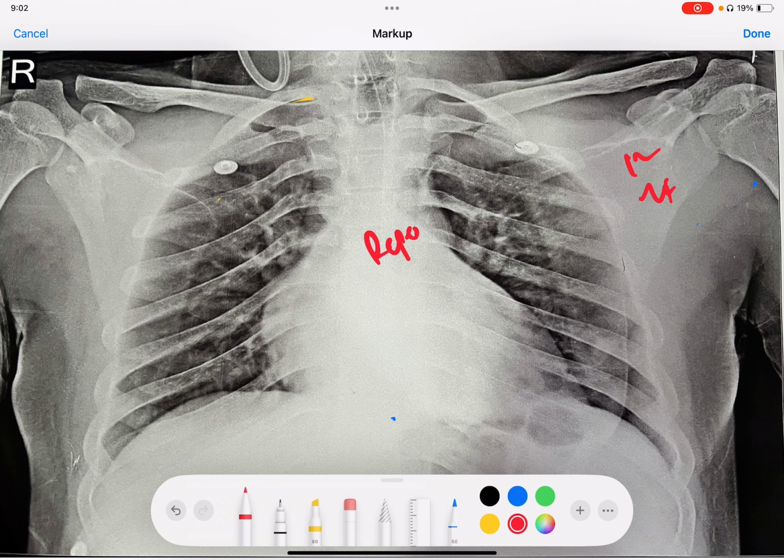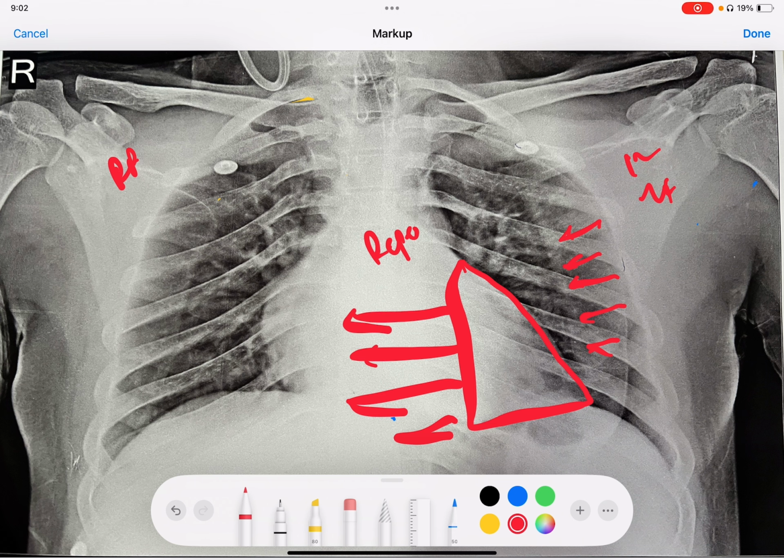We see if the patient's tachypnea, shortness of breath, RR is improving or worsening, or if the patient has tachycardia, then definitely we need to repeat the X-ray. And if this pneumothorax is worsened or increased, and if it is causing collapse of the lung, the next thing which will happen will be shifting of the heart towards the right side, towards the opposite side. So there will be not only the collapse of the lung, but the mediastinum will shift, the heart will shift, that will put more stress on the heart, so that there will be tachycardia, there will be shortness of breath.